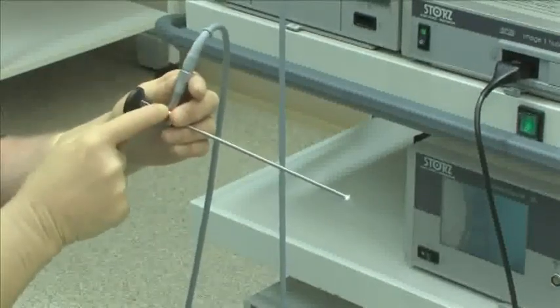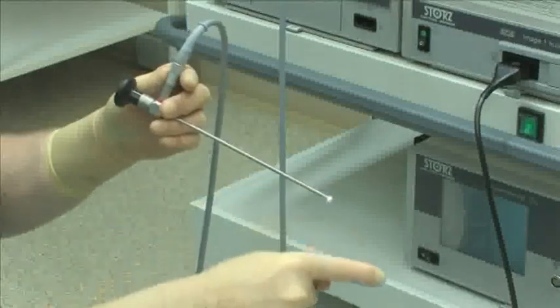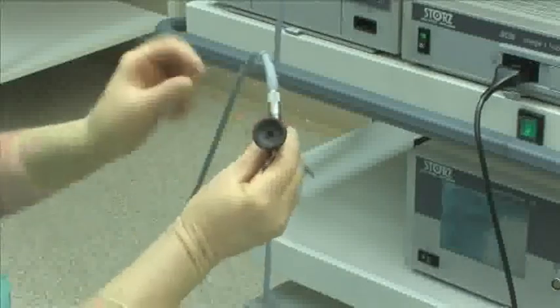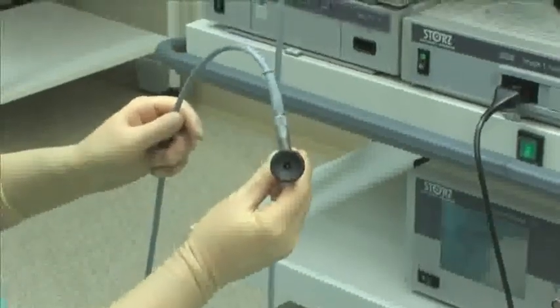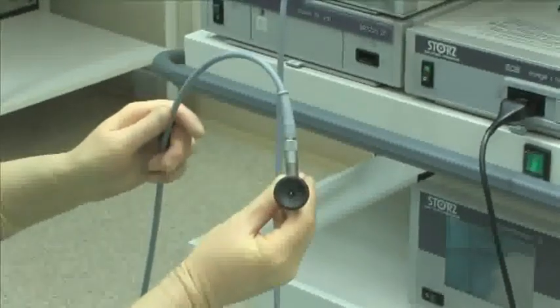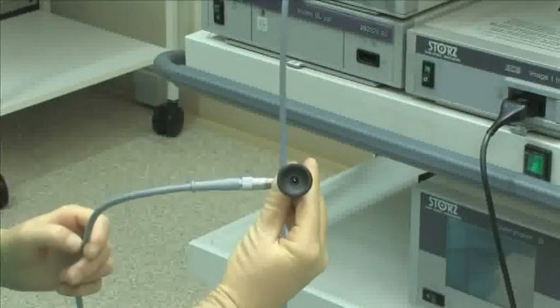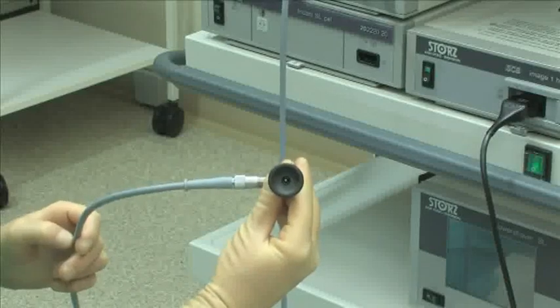The light cable is connected to the endoscope to illuminate the intra-articular space. The light cable is virtually always positioned opposite to the endoscope's angle of view. The position of the light cable is indicated with clock positions. For example, positioning the light cable at 12 o'clock delivers a view at 6 o'clock. A 9 o'clock position of the light cable delivers a view at 3 o'clock.